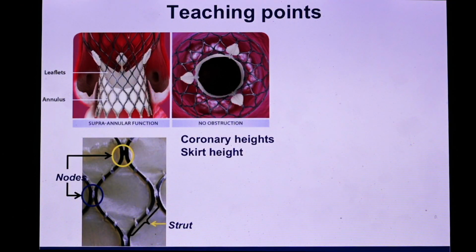And the one thing that I was really surprised with as a first year general cardiology fellow is I was impressed that you could possibly put a diagnostic or guide catheter through these small cells, but then I learned that this small cell can actually accommodate up to a 10 French catheter. So as long as you don't damage the skirt, you can still intervene. And as we are proceeding with TAVR in the intermediate and even the low risk patients, I think we need to have a real good idea about what kind of things we can even do after we put in this CoreValve.